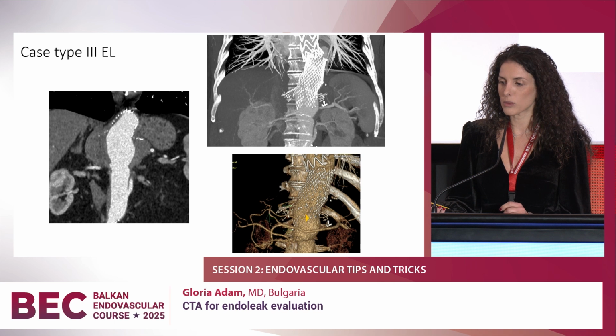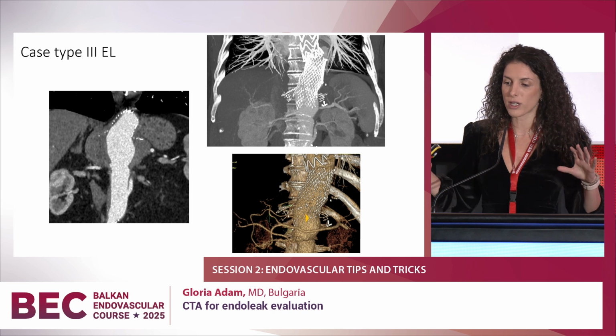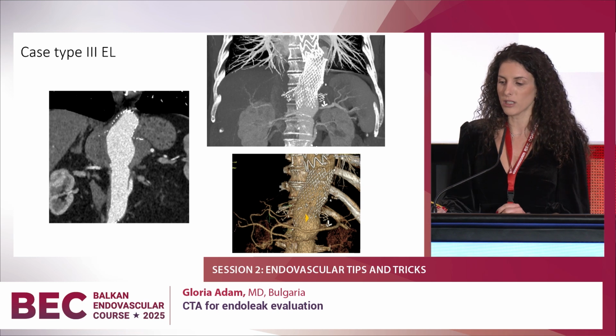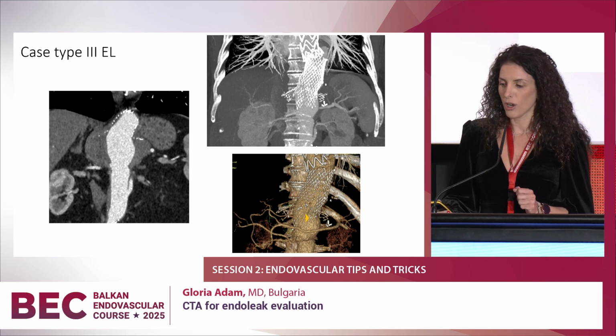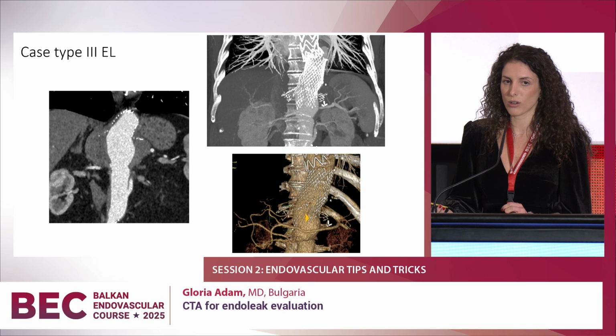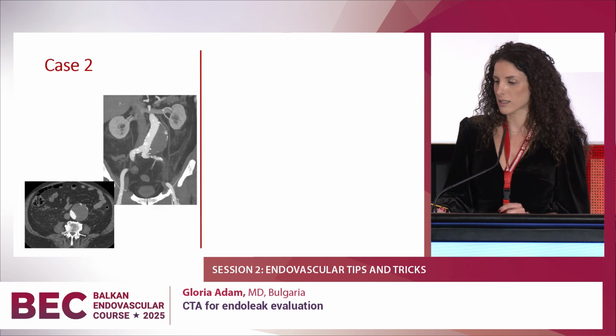And what happens with the sinus XL graft? Destruction in the lower 1/3, probably due to the pressure of the new form aneurysm of the abdominal aorta. And actually, this patient, today, he must have had a procedure of stent graft with fenestrations for the vessels that are coming out of the aorta, and we will see what the result will be next week.